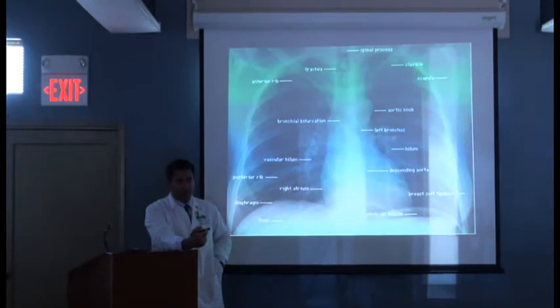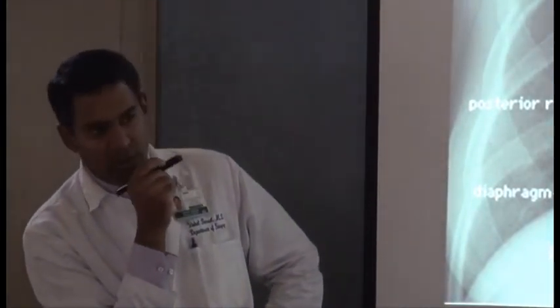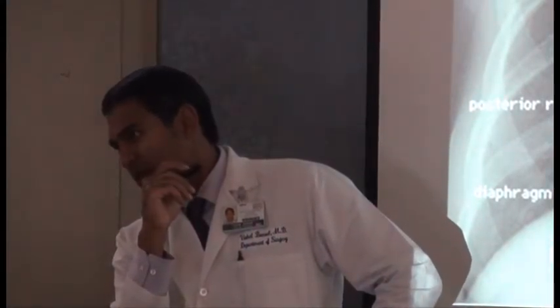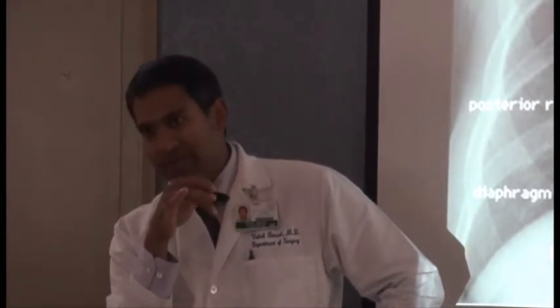We're going to go over x-rays. And what I'll do, I'll try to spend most of the time on chest x-rays. The ABCDs of chest films, all right? What you have to do anytime you read a chest film is you have to do it systematically. If you don't do it systematically, then you're probably going to miss something. So what I always do is the ABCDs.